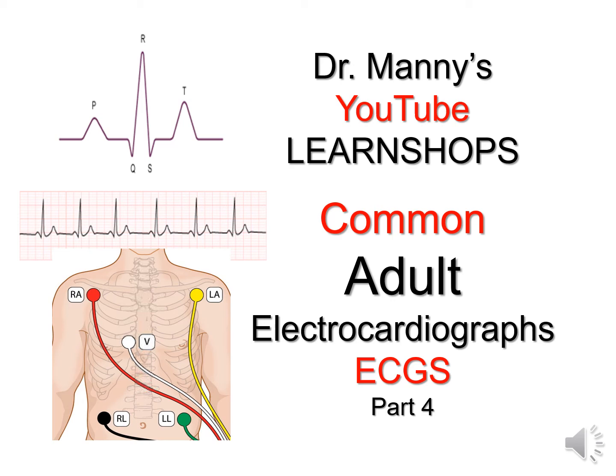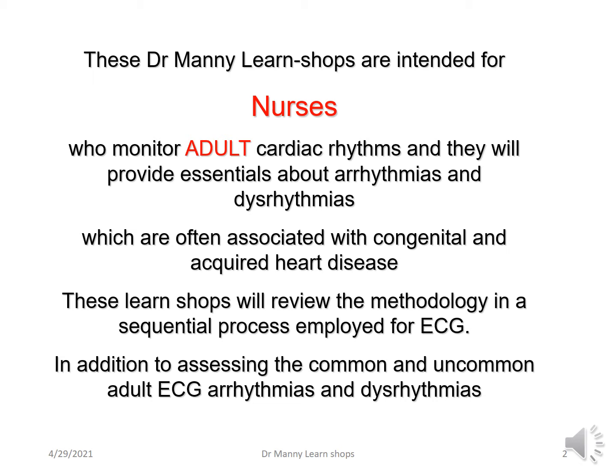Hi everybody, welcome to part 4 of common adult electrocardiographs. This Learnshop, as with the previous ones, is for all nurses and healthcare providers who monitor adult cardiac rhythms. And in doing so, we'll be assessing common and uncommon adult ECG arrhythmias and dysrhythmias.